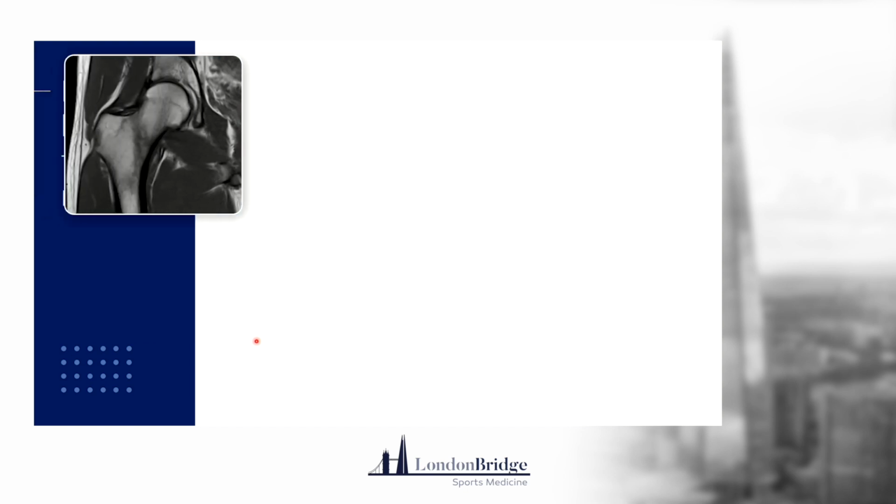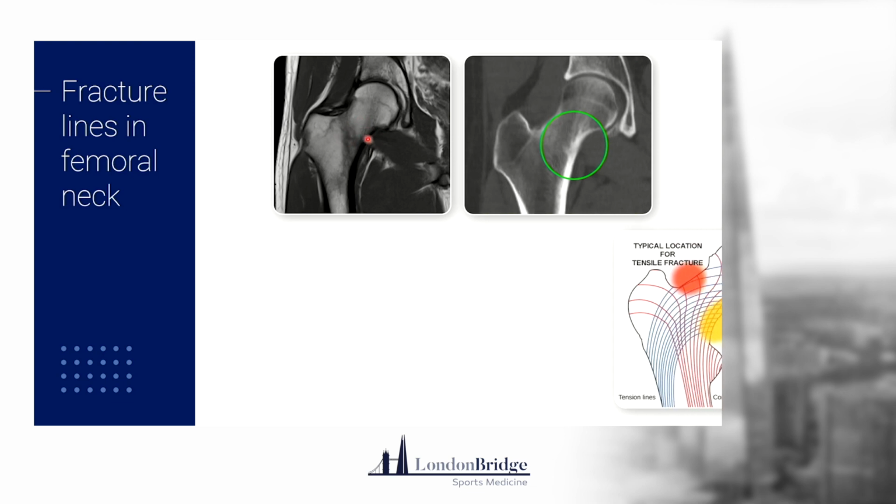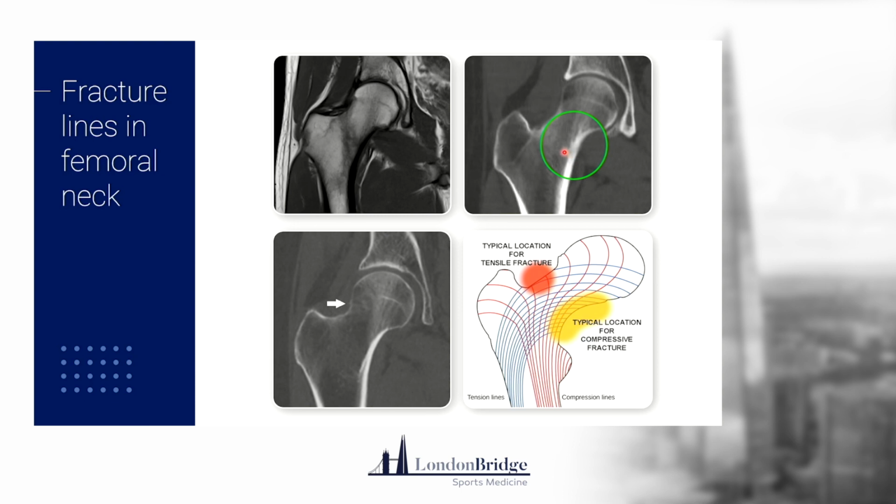Fracture lines, again, sometimes we talked about MRI not being overly clear. This is an MRI for femur fracture lines. Here you can see a healing fracture line. So if you pick this up and the patient was 8 weeks, 10 weeks post injury, you could say actually it's the right time for a CT. With a CT you can really diagnose whether the fracture is healing, whether there's sclerosis around the fracture site, and you can give a clear indication of where the fracture site is.